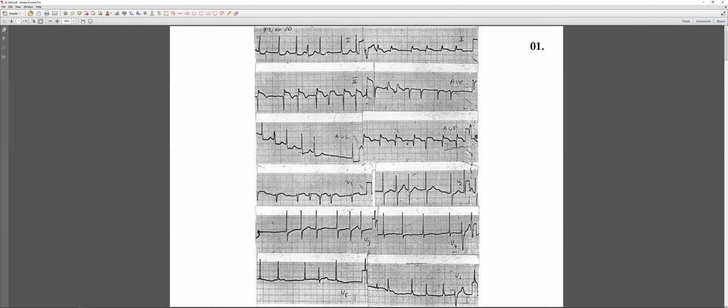To calculate the mean electrical axis, lead 1 is positive. Okay. And AVF is negative. Okay. So there's a right axis deviation. What did you say? No, I meant left, actually. I said right, but I meant left. Go on. So there's a left axis deviation. And that's normal because this AVF is about equiphasic, so you can say that's normal. Okay. Go on.